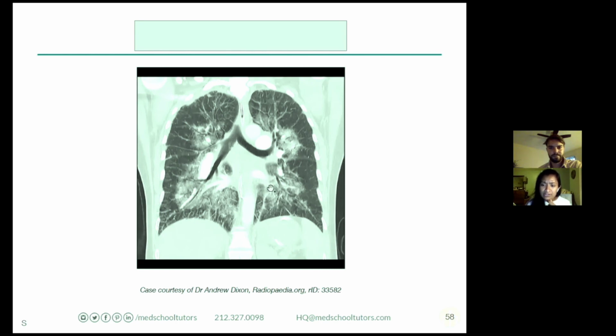A lot of septal thickening and a lot of vessel engorgement. So this is also in a very central pattern. It starts near the hilum and branches outwards. Think about how I may have used those same terms before: central pattern, branching outwards, and this white opacification in a branching pattern. What does that remind you of? Perfect. A bunch of people are getting it already. Good. So this is always going to be central, branching, pulmonary edema, the end.